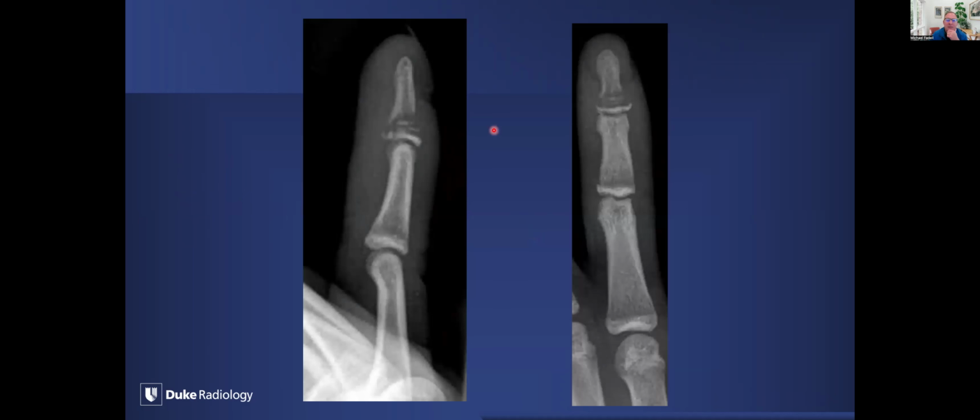Okay, so here's a pretty bad fracture. It doesn't project very well, but in this particular case, we can see that there's some injury to the nail bed, so high likelihood of osteomyelitis, and it should probably be treated prophylactically with antibiotics. This is a pretty bad fracture here. It looks like it involves the metaphysis, potentially the epiphysis, so this could be a Salter 4. Again, not so worried about the growth arrest, just about the healing.